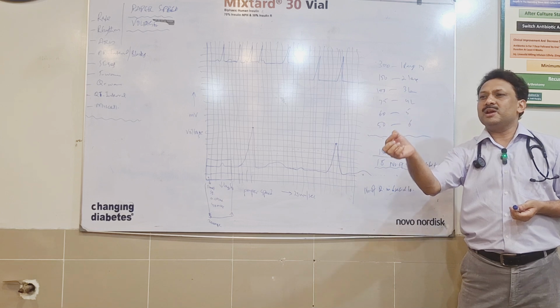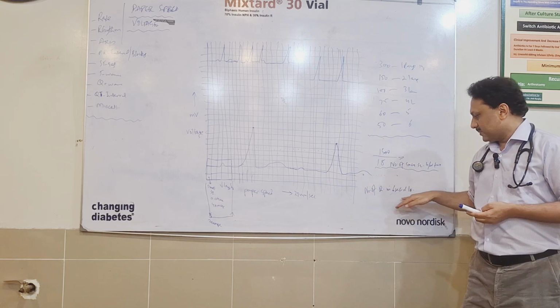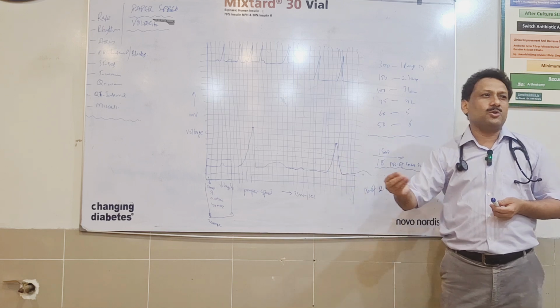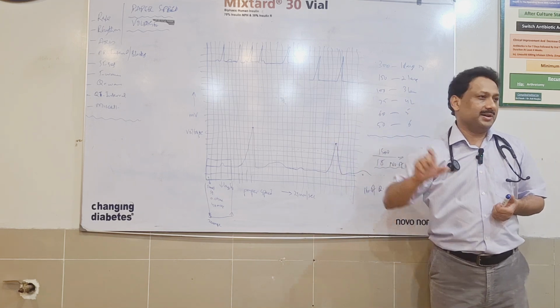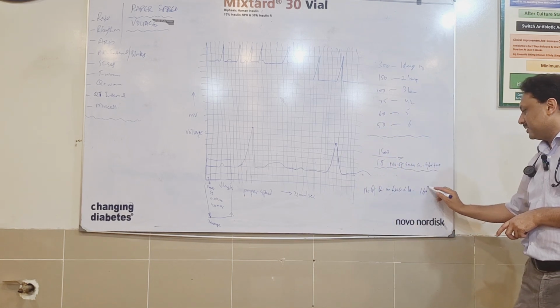So you just need to calculate the number of R in total 6 seconds. Say it turns out to be 16 R's in 6 seconds, you will multiply 16 with 10 and the answer will be 160.